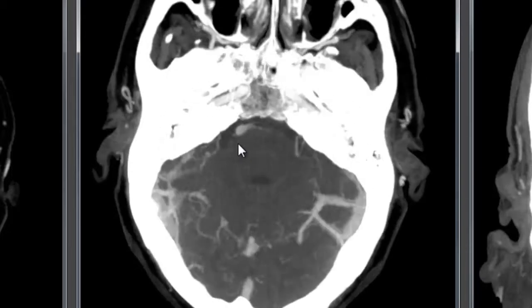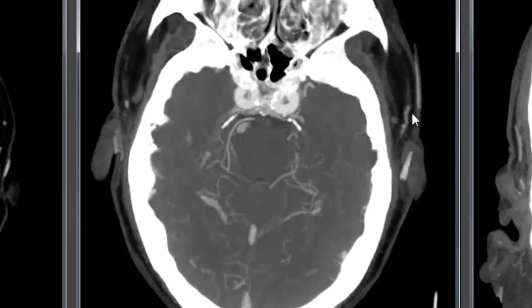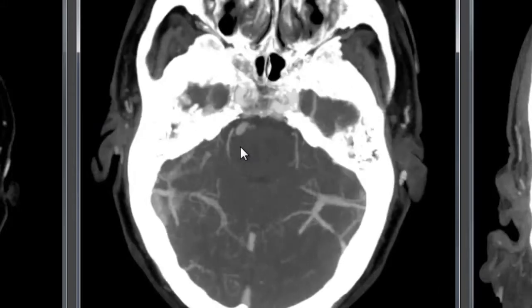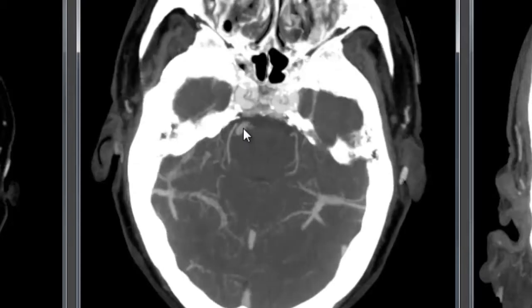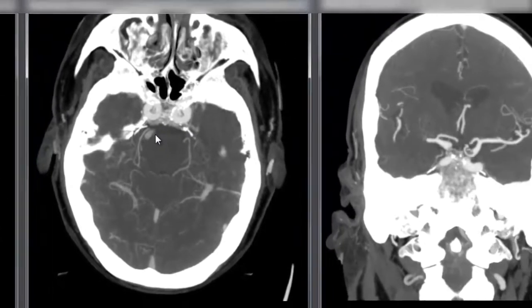So essentially, as we talked about in our video on ICA occlusions, we have contrast coming up, but far less opacification of the proximal vessel by the direct injection compared to the anterior circulation in this case, because of that occlusion at the top of the vessel. There really is nowhere for the contrast to effectively go through a main artery. It can go through basilar perforators into the brainstem, but that's a much higher resistance system, so there's just not as much flow of contrast opacified blood into that vessel below the site of the occlusion.